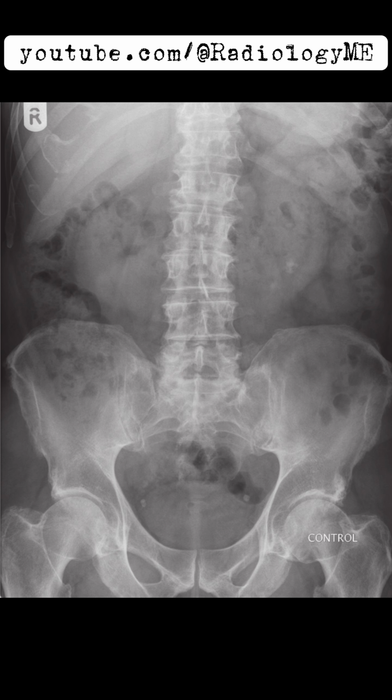All right, so we're dealing with a case that presents an abdominal radiograph of a skeletally mature patient. The first thing that stands out is the alignment of the kidneys. Unlike the typical lateral orientation of the long axes, these kidneys are projected medially. As we look closer, we notice that both kidneys appear to be fused at the lower poles, and there's an impression of them being pulled towards the midline, particularly at the level of the L4 vertebra.